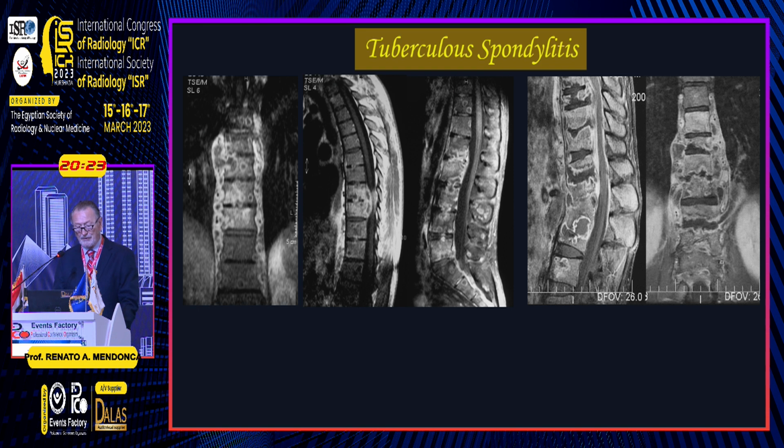In tuberculous spondylodiscitis, on the other hand, the necrosis is mostly inside the bone. And the diffusion of the infection is mostly through the prevertebral and the extradural spaces, not through the bone and the disc itself. So the discs are relatively protected against the infection. So it's possible to make, with a certain degree of confidence, the differential diagnosis between the two conditions.